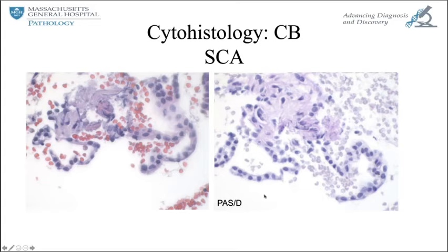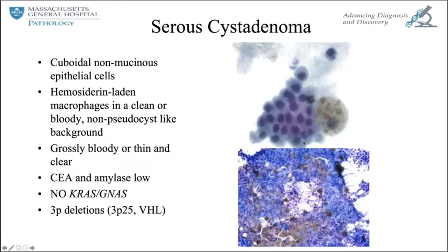So just the smallest little scrap of tissue can be sufficient to take a non-diagnostic specimen to diagnostic, because I can promise you it is very difficult to get intact serous epithelial cells in a specimen, especially when you make a direct smear. This type of sample is very unusual to get, with delicate, glycogen-rich epithelial cells maintaining their cohesion and cytoplasmic and nuclear intactness. This was just a rare, beautiful example.